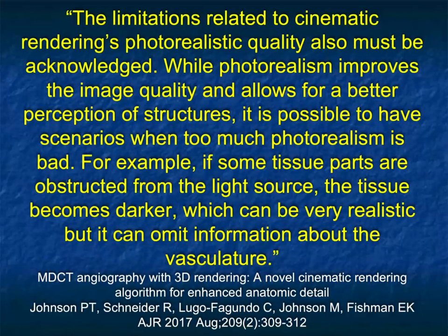Now, there are limitations, of course. While photorealism improves the image quality and allows for better perception of structures, it's possible to have scenarios when too much photorealism is bad. For example, if some tissue parts are obstructed from the light source, the tissue becomes darker, which can be very realistic but omit critical information. One of the things we realize, even going forward 6 years, is that with cinematic rendering, I could show things that are hidden in the data set, like a small pancreatic cancer, but if I don't render correctly, I can hide things that are in the data set.